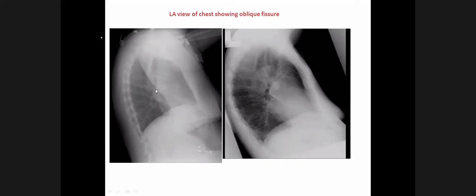During its projection, the X-ray can transmit into the right and the left. So any pathology in the right or left appears in this area. So from the lateral only, it is difficult to differentiate between the side, right or left. You got me?